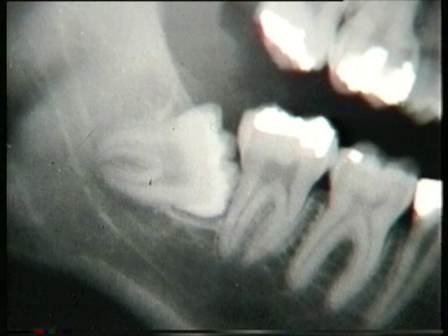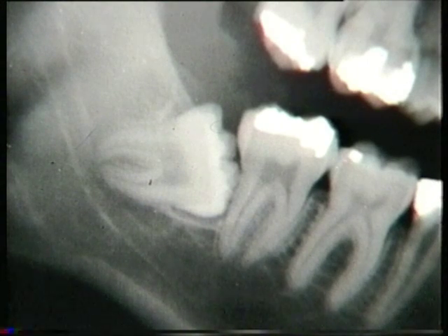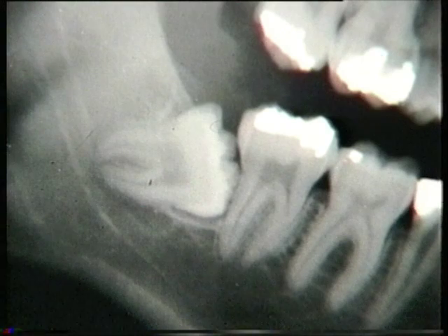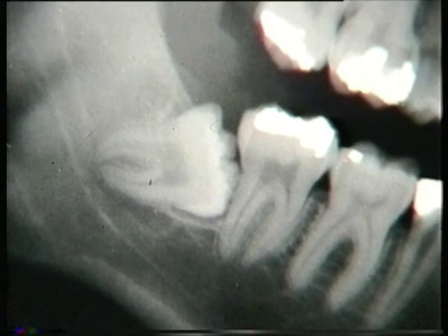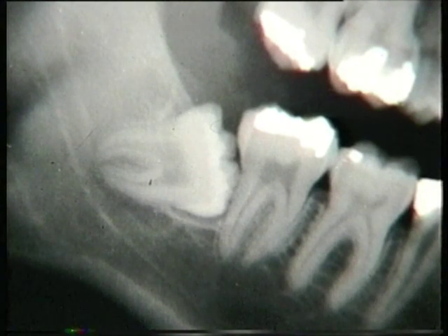It's horizontal. Also, we can see that, since the crown of the third molar appears to be coming towards us, it's in lingual version. It's also quite deep, so we are going to need good access. And in this we're lucky, since the distance between the distal surface of the second molar crown and the ramus of the mandible is wide, so we have enough space.